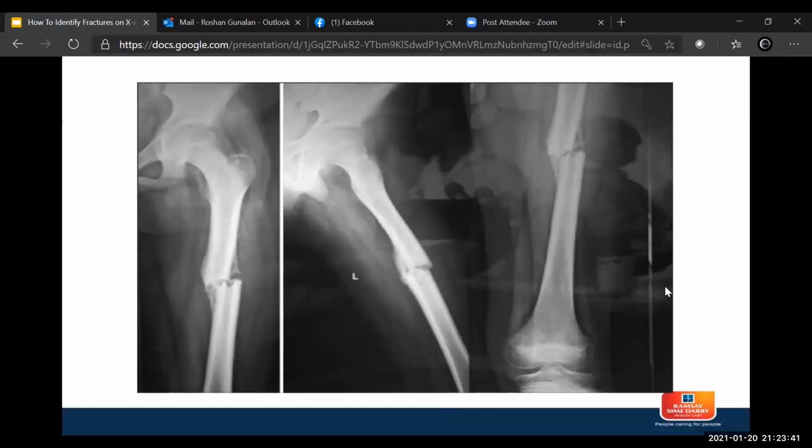Lim Taiping said there's a fracture from Mr. ABC dated XYZ. This is a left mid shaft comminuted fracture. Closed mid shaft, comminuted. Serena said fracture of the left femur, comminuted, displaced, angulated. NRSH said left mid shaft of femur comminuted fracture. Most say the same thing.